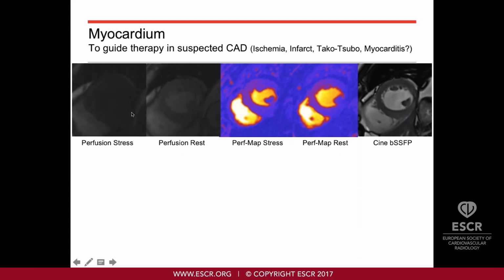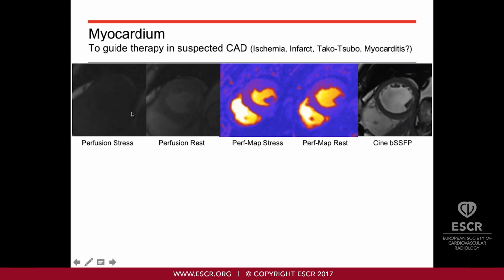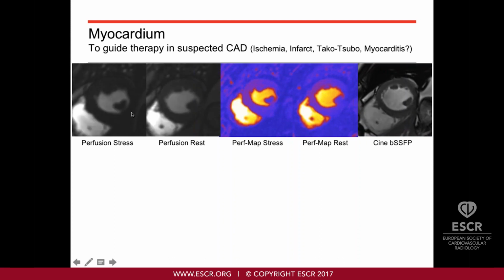However, it would also be consistent with a scar in this area, a scar that is hypoperfused, because a scar is bradytroph tissue that doesn't need a lot of oxygen and metabolites, and this is not so easily visible on the rest image because here we already had injected contrast material during this first pass.